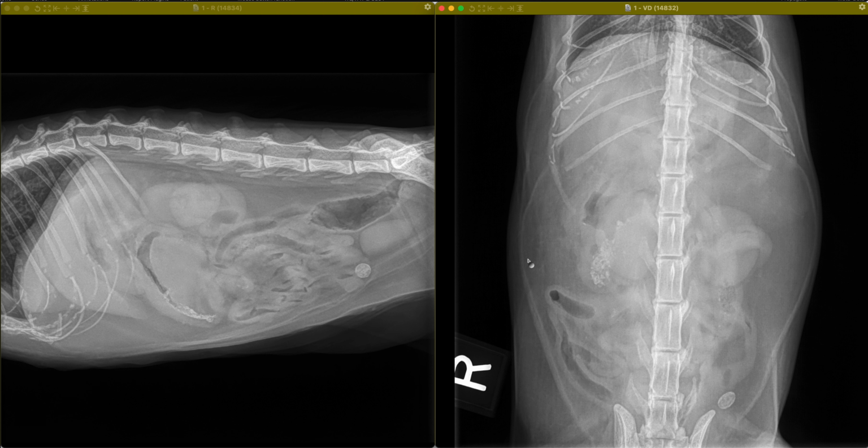And so we're going to conclude that there is the presence of a small intestinal mass with a gravel sign. And so that indicates that there is the potential for partial obstruction of the lumen. Our primary consideration is going to be given to an infiltrative process, specifically neoplasia. Our top 2 differentials are going to be lymphoma or gastrointestinal adenocarcinoma. We could consider infectious etiologies such as things like pythium. However, this is going to be dependent on endemic infectious processes in the region where this cat lives.